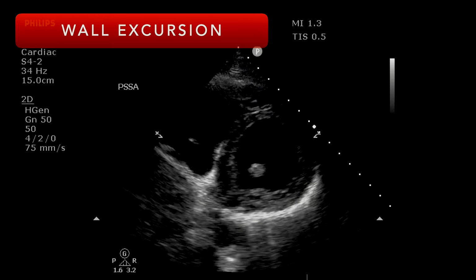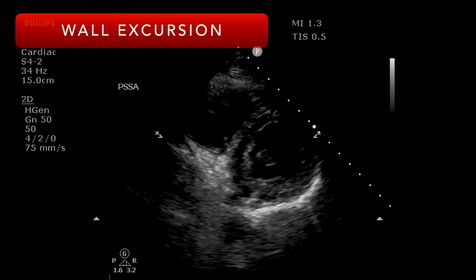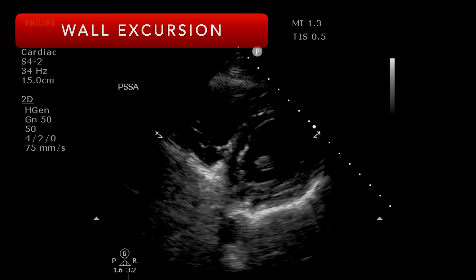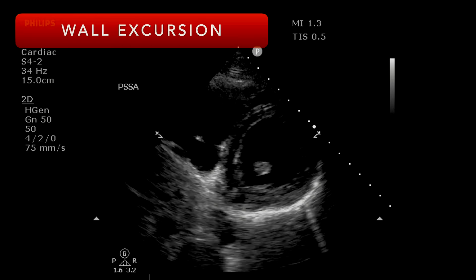So with that being said, that broad kind of understanding or background of the two different factors that result in this change in volume that we're looking for, how do we interpret that? Let's look at some examples of what we're trying to find, right? What we're trying to see, so that when we go to the bedside and then correlate it with what we're seeing at the bedside, we can kind of know where our patients fall on this continuum.